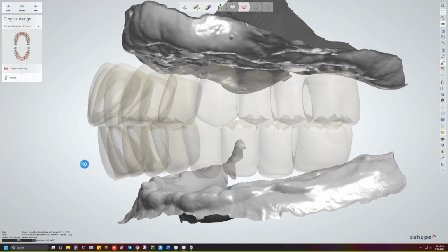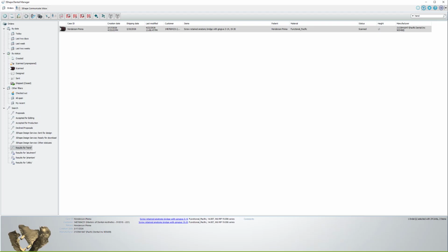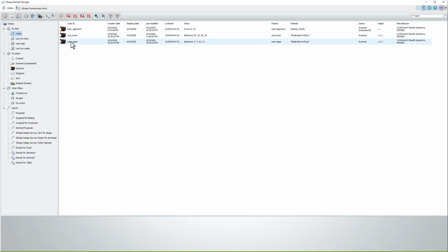And I just really wish 3Shape had a better way of bringing all of the implant information into one order at the same time. But again, while this is loading, we'll come back here. It was literally 3 orders. We have our final, and the upper and the lower, including the bite alignment. But this is the workflow. It's 4 orders for an upper and lower.